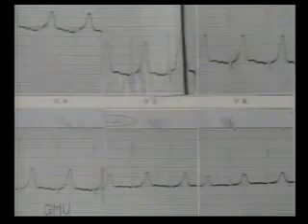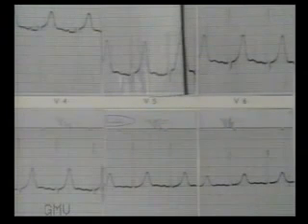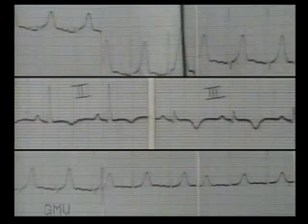The tall T waves are most noticeable in the chest leads. When tall T waves are seen in chest leads, first look at inferior wall leads, that is 2, 3 and AVF for inferior wall infarct. Here leads 2 and 3 show inverted T waves with Q wave in lead 3, suggesting that there is a recent inferior wall infarct. So the tall T waves is a reciprocal change in the chest leads.